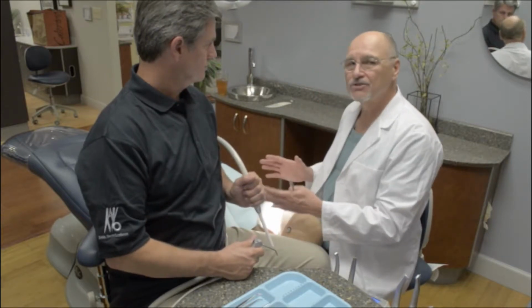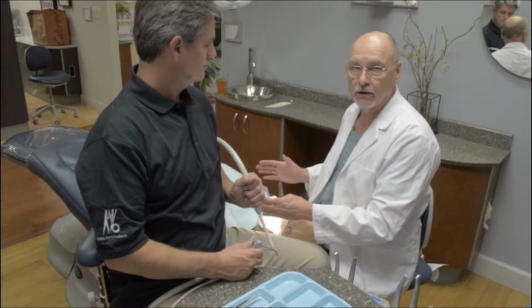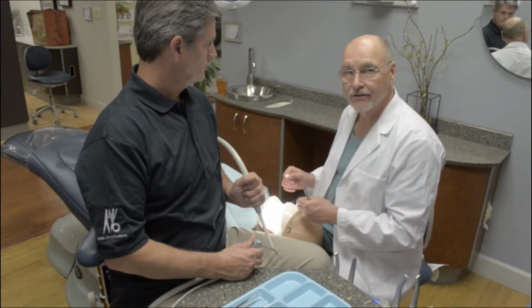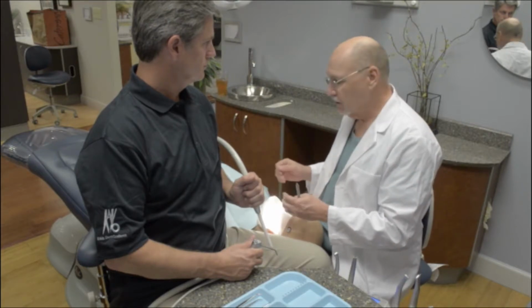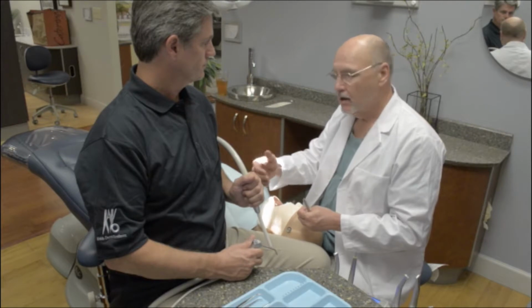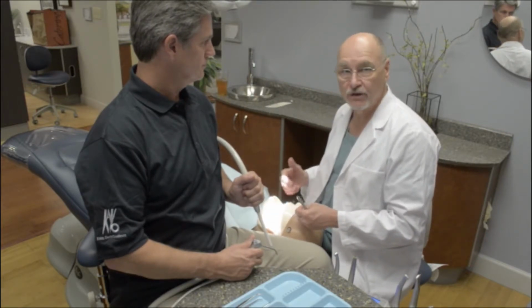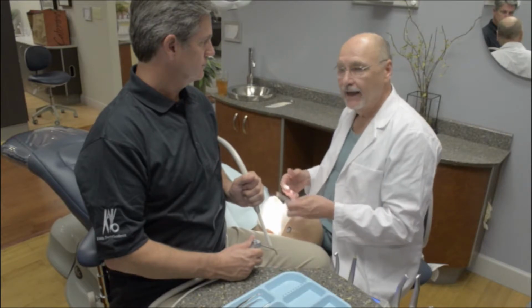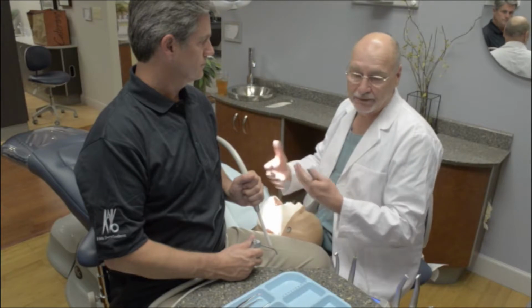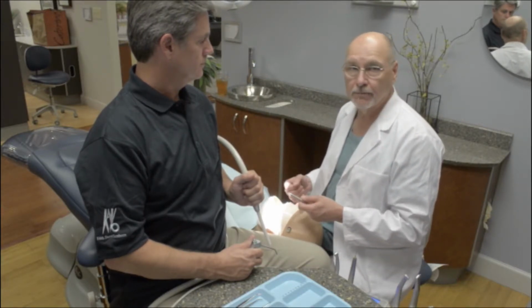The only way this really can happen is if we have a very narrow dental chair. And when I say narrow, one that's probably 24 to 27 inches wide is critical. The wider the dental chair, the farther away the assistant is. The farther away the assistant, the less that she or he can visualize of the oral cavity and the operative field, and thereby becoming less and less of an active participant in the treatment of the patient.